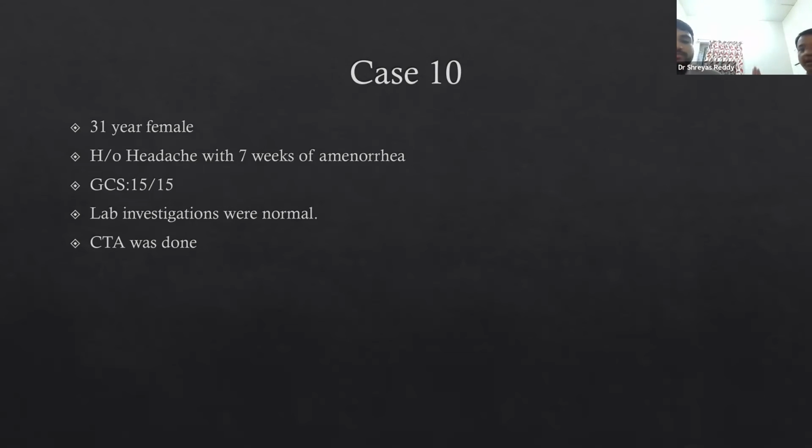In view of headache, thunderclap headache, young patient, GCS is maintained. Headache, what do you think of? Thunderclap headache, I would think of subarachnoid hemorrhage. Yeah, SAH. So first thing what you do is CT, plain. Can you interpret the plain CT for me?